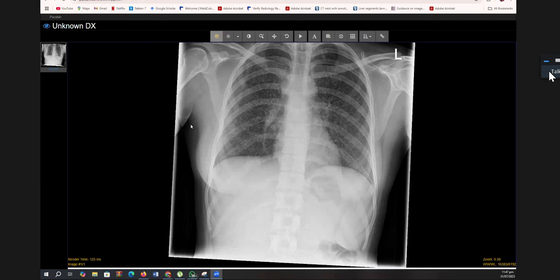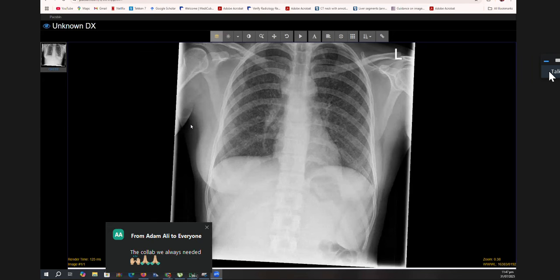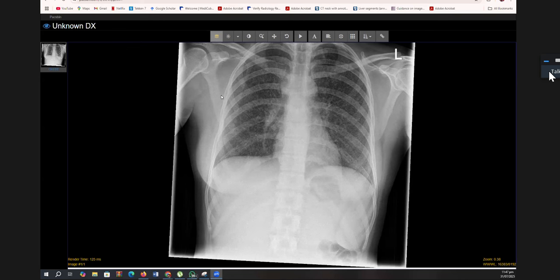I'll just stop you there. Now, in the exam, the examiners will help you. I can understand why you might think there might be a mastectomy, but quite often the breasts can be asymmetrical due to technical reasons, and that's the case here. So the breasts are intact. Okay, sir. Now tell me what you think the nature of these nodules is.